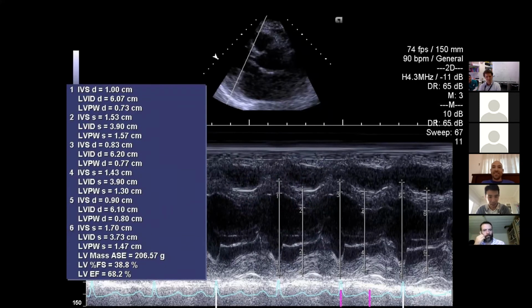What do you think about this image? Yeah, so it's showing that it's got an increased ejection fraction, which is what you'd expect for a low resistance vent with a regurg. So do you trust this? What's wrong with this? This is consistent with mitral regurgitation. Do you trust the value though? What's the value? You've got the ejection fraction. Do you know what it's called?